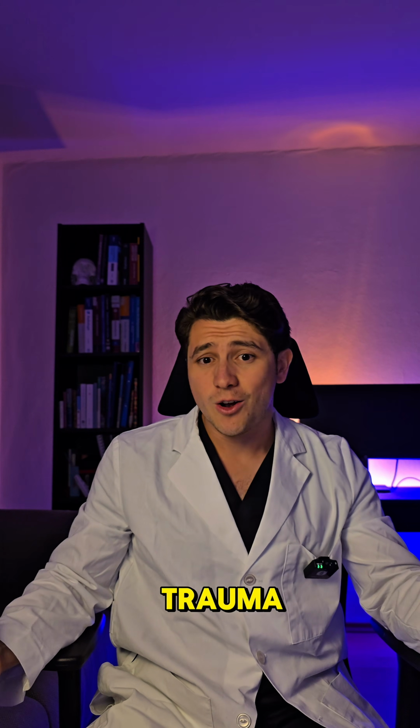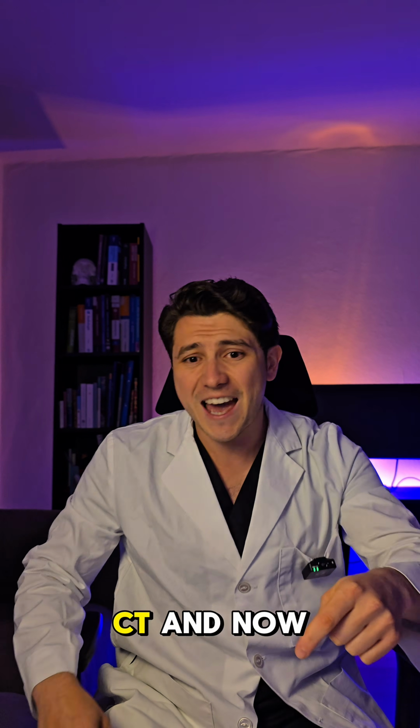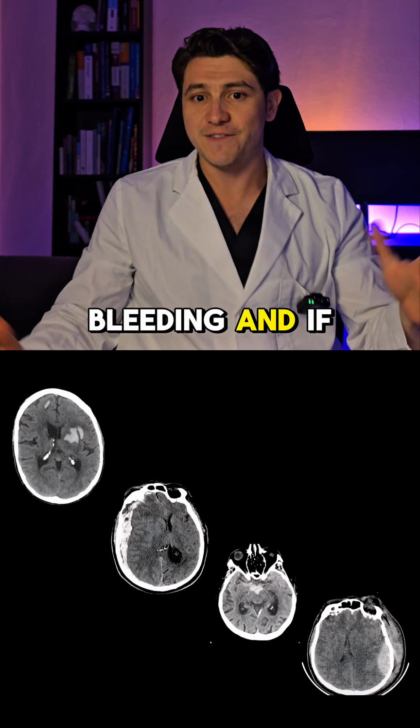You've got a patient with head trauma or a thunderclap headache. You open the CT and now the first question is: is there a bleed? And if yes, what kind?